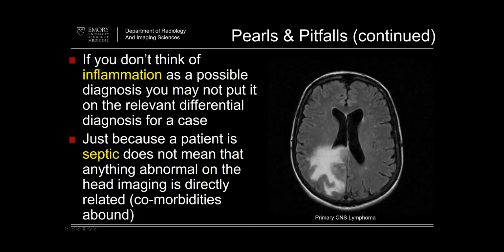And like I was saying earlier, this is an appearance of vasogenic edema. You get the idea there must be an underlying lesion, and you can kind of make it out right here. There's a mass right there, and relatively less intense on the FLAIR. And this is a reaction to that. Are there tumor cells in here? If it's lymphoma, maybe there might be some. If this is a glioma, then there probably are. If this is a metastasis, there probably aren't. Just in terms of thinking how those things fit together.